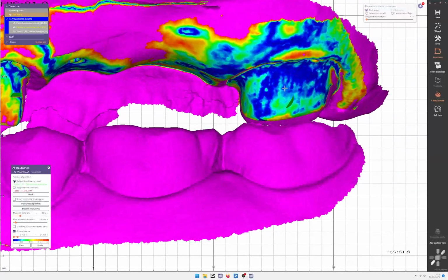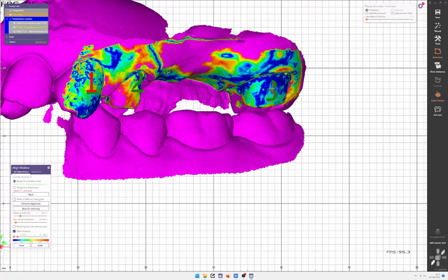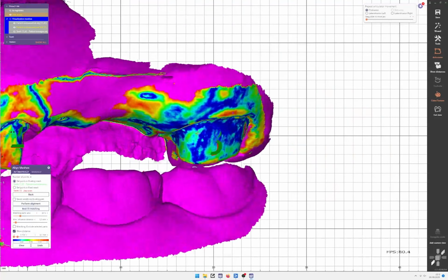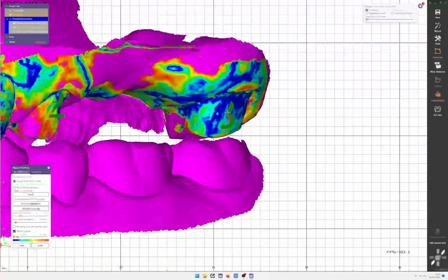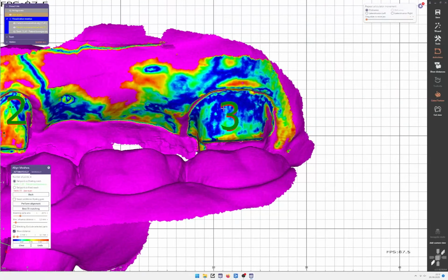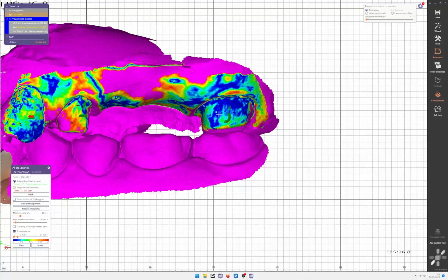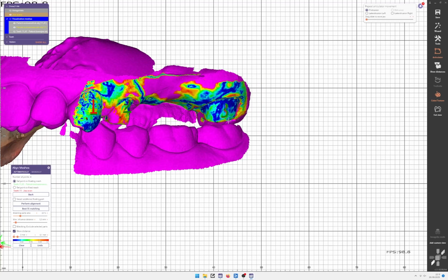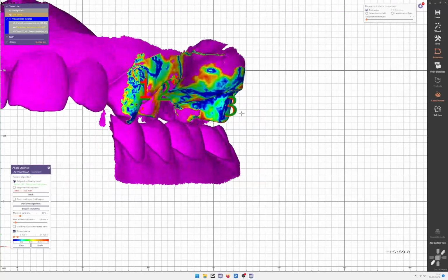The more vertices get really close, that gives it a positive feedback loop, and it moves the mesh around a bit more and checks if it gets a higher number of even lower deviating vertices, and it does this a bunch of times until it gets the most optimal result. So this now you see is much better than what it was before.